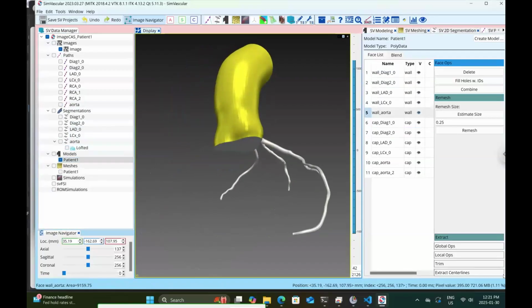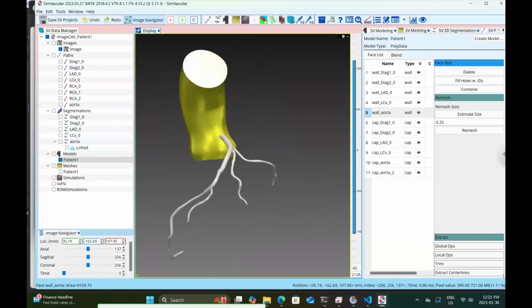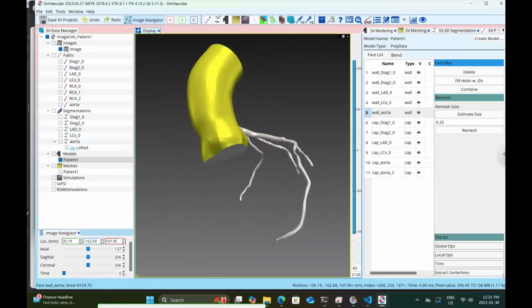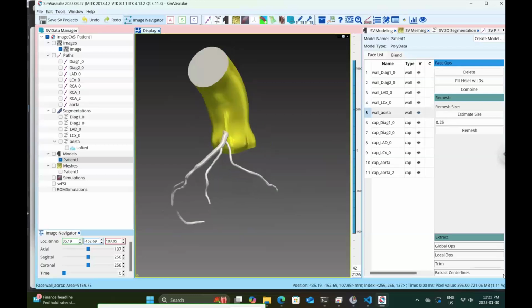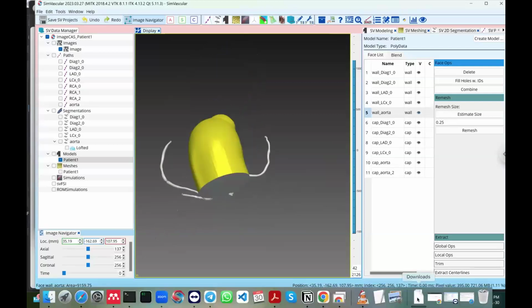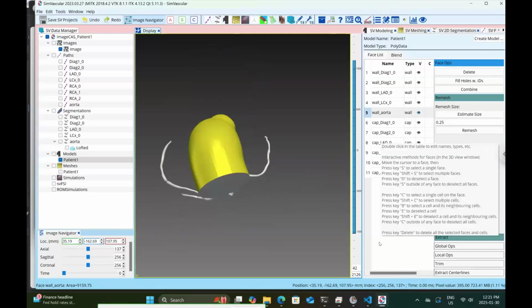Okay, so now Anna can show you how to do this. Anna, does it look good enough, or should we be doing 3D, or should they be doing 3D? We can give it a try, maybe. Yeah, I think we can do that in 3D Slicer. I think for now we should just stick with 2D. And then once they're more comfortable, we can come back to doing a 3D segmentation.